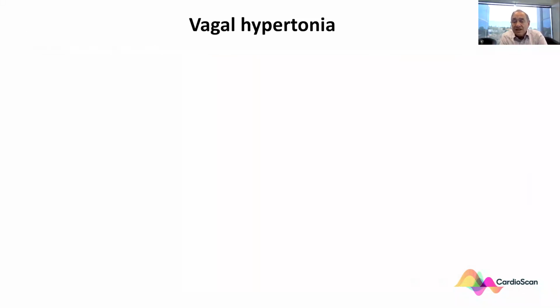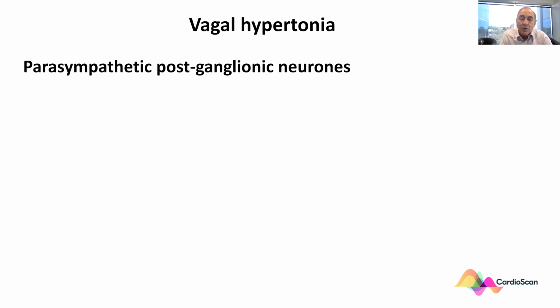So looking at all this, we come to the conclusion that there is something going on with the vagus nerve, and that it is causing both a bradycardia as well as a Wenckebach AV block. How does this occur? Well, let's look at the way I look at it.